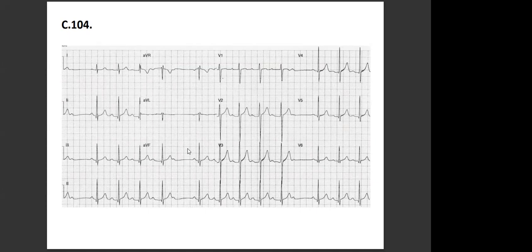Arrhythmic. The heart rate is around 80, between 80 and 85 beats per minute. I looked at lead 1, which is pretty equiphasic, and AVF is positive, so I'd say the axis is pretty normal, around 90. And because the PR intervals are more than 5 blocks, and I can tell that the last PR interval before a dropped QRS complex is longer than the first one, I'd say this is a 2nd degree Mobitz type 1. Correct. And the QRS is narrow, so there is no intraventricular block. Okay, good.